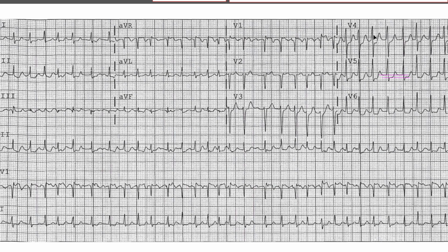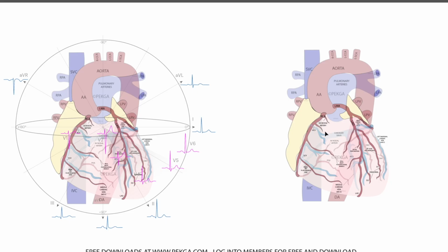Okay, where am I going with this? Oh, yes. So ST depression. There's something known as tachycardia-induced ischemia. And what that is, wait, hold on, let me see, right here.